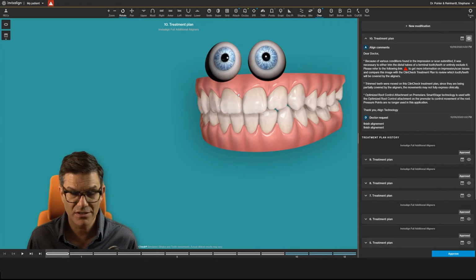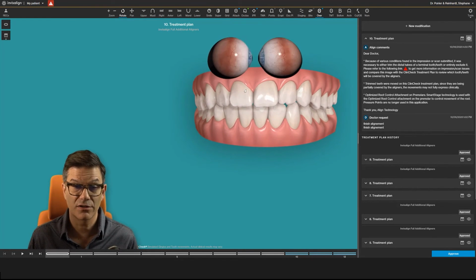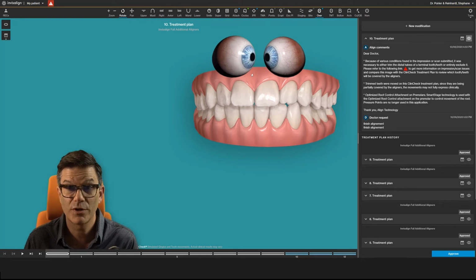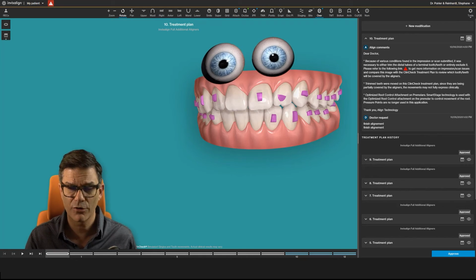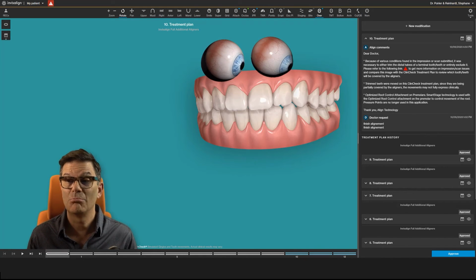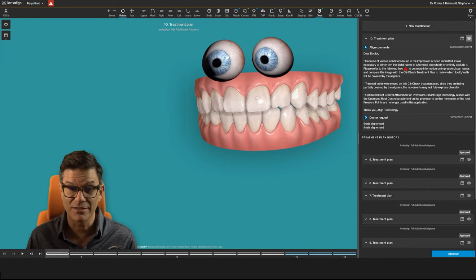You have to see things, and there are a lot of different places where you can have information. We give some courses at the C.L.E.A.R Institute. We go over all the ClinCheck Pro and everything, but try it, use it.